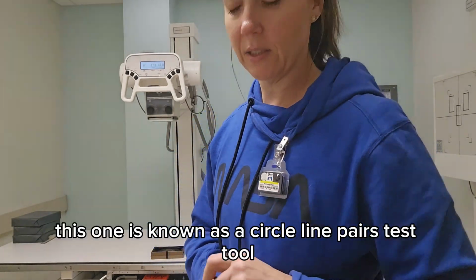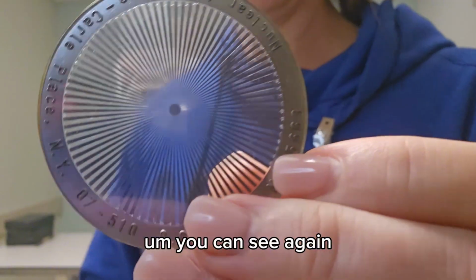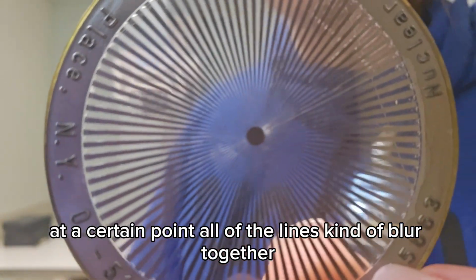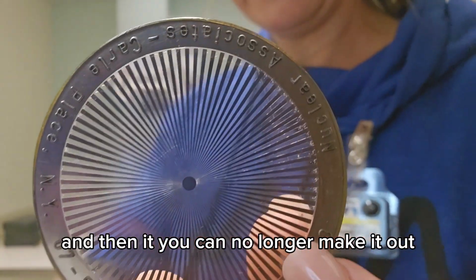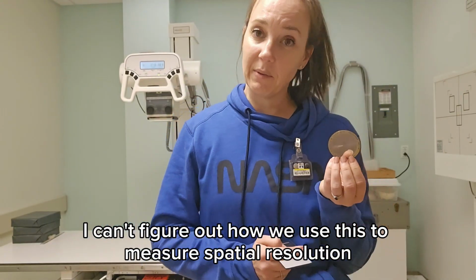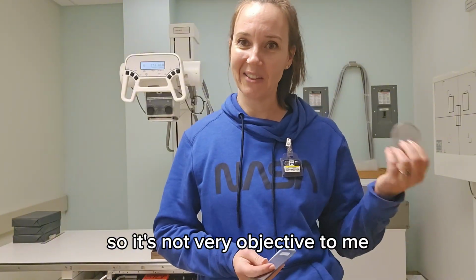This one is known as a circle line pairs test tool. You can see again at a certain point all of the lines kind of blur together, like right here in the middle, and then you can no longer make it out. I can't figure out how we use this to measure spatial resolution, so it's not very objective to me, so again, I don't use it.